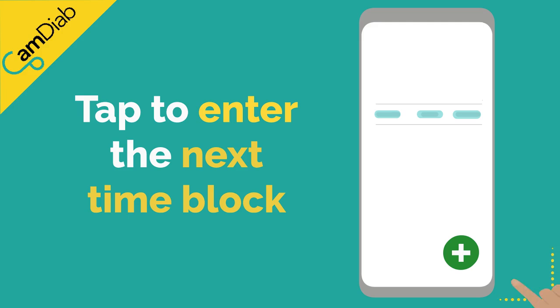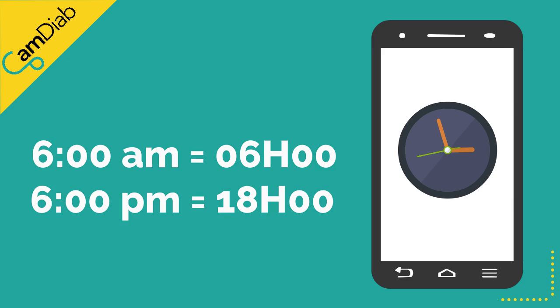If more than one time block needs to be programmed across the 24 hours, please tap on the green plus to enter the next start and end time as well as the glucose or insulin to carbohydrate value. Please note that the app uses either the 24-hour clock or AM and PM depending on the phone's time setting.